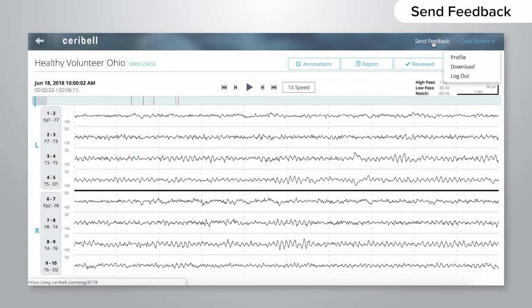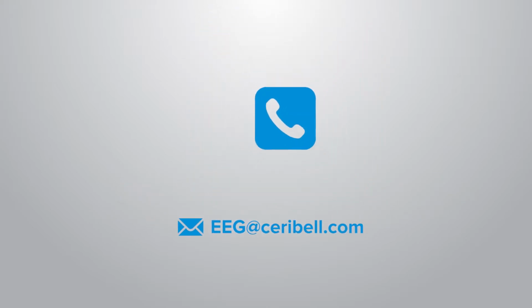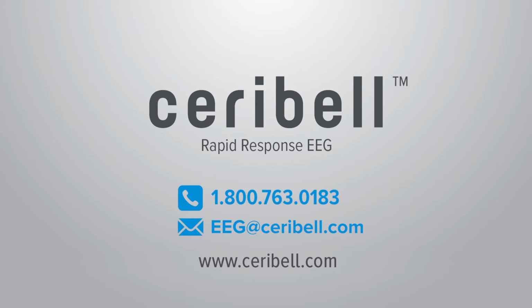Also at the top right of the screen is a Send Feedback link. Ceribell welcomes your feedback and suggestions for improvement. If you have any questions while using the Ceribell system, you can always contact Ceribell Technical Support by email or telephone. The contact information for technical support is located on the Ceribell website and also on the back of all Ceribell EEG recorders.